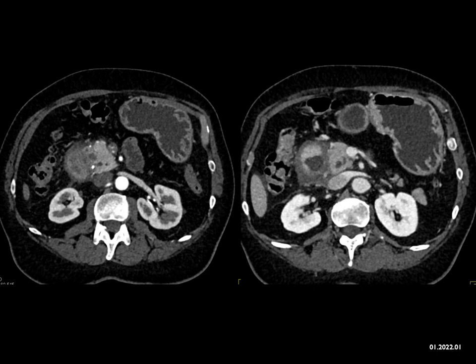Again, you have limited images, one could argue, but why am I showing you and focusing on the duodenum as well? We know adenocarcinoma of the pancreas can invade the duodenum, but that's more medial and it's more irregular, and you would see other changes, including a low density mass in the pancreatic head. And simply duodenitis would not explain the interface between duodenum and the head of the pancreas and the pancreas proper.